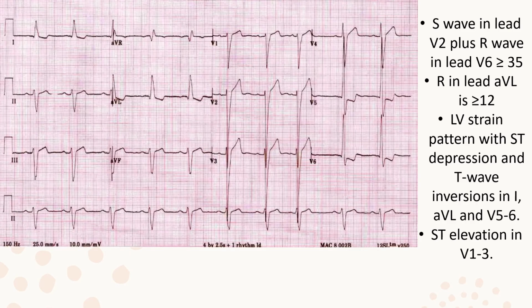Okay, so let's see here. Remember we started off and we said we're going to look at V1 and V2, and which one's bigger? Well, by far, V2 is bigger in this EKG. Would you agree? It goes all the way from here down to here. So we're looking at 5, 10, 15, 20, 25, 30, 35, 40, almost 45 just in V2.